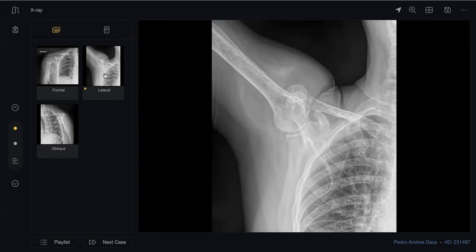It looks like a well-defined calcified bone lesion. You told me that this is a non-aggressive bony lesion. What could be the diagnosis? Could be myositis ossificans. We are talking about bone, dear.